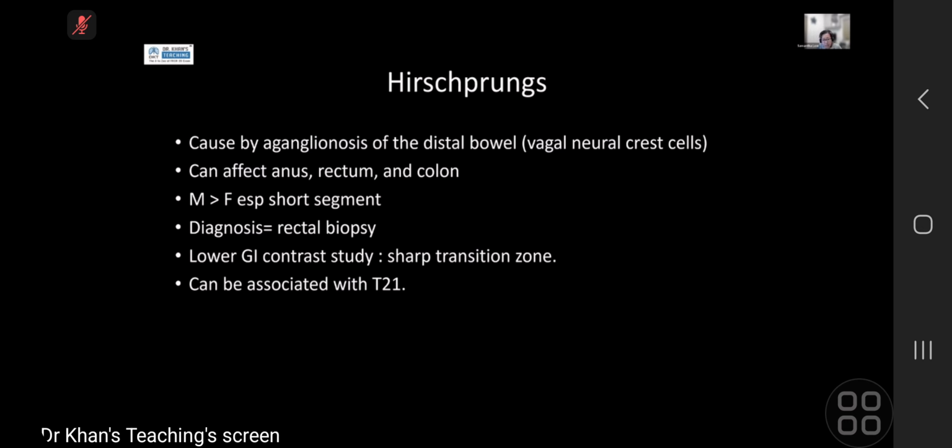And the good thing here is that your contrast study cannot say this is definitely Hirschsprung's disease, but what I can say is that you can suggest that it is because of the reversal of the ratio and also the evidence of the spasms. And when you tell the surgeons that, what they'll do next is a rectal biopsy, which is the gold standard test. With any biopsy, the risk is perforation, and I think so far I've only seen one, so it's a fairly safe procedure.